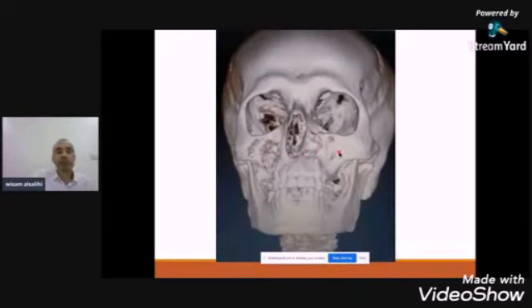This patient came to me 3.5 years ago with left maxillary sinus adenoid cystic carcinoma. I did a medial maxillectomy, Denker approach for him. See the defect after surgery. Now, a few months ago, he came to me with a right maxillary sinus tumor, a recurrence of the same tumor but on the right side. See how the defect is in the anterior maxillary face.